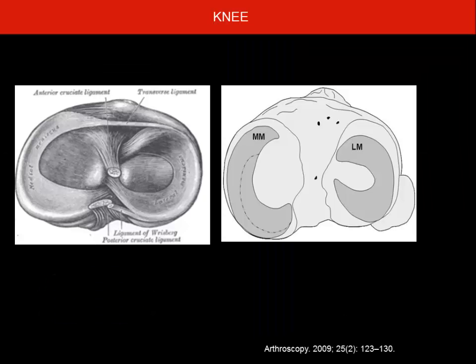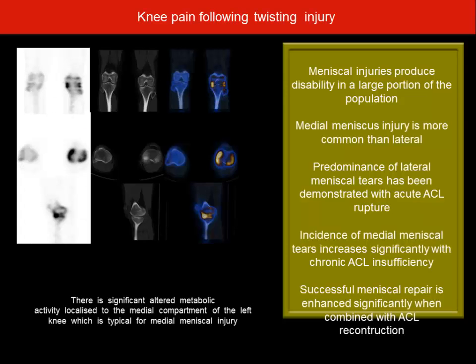Moving on to meniscal injury, again the role of nuclear medicine here is very minimal. If there is any soft tissue injury, MR will play a significant role here. This is the medial meniscus, that's the lateral meniscus, and whenever you see a half moon shaped appearance on a SPECT scan, people in the past used to say it is a meniscal tear. That was in the 80s and 90s, but now after MR, very less frequently do we use bone scans to assess meniscal tears or any soft tissue knee pathologies.